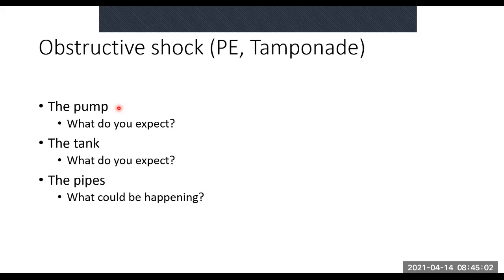Whereas in tamponade, what do you expect in the pump? Yeah, it's restricted, exactly. So you expect to see this effusion that's around, and you'd expect to see this heart that's unable to expand.